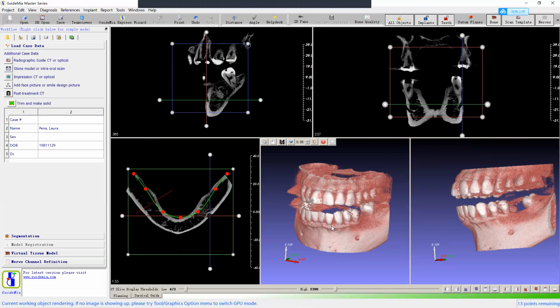So that's the last button. Another one in all of those windows is this red button, red dot, to record a movie. Everything happening in this window can be recorded after you turn this on. After you finish, it's going to generate a movie file, which is an AVI file. We'll show you how it works later. All of them have this recording button.